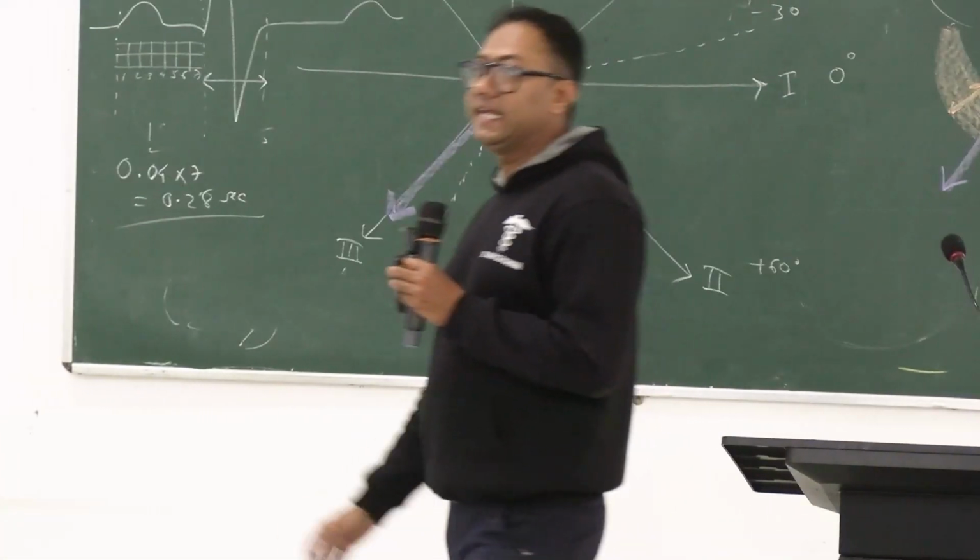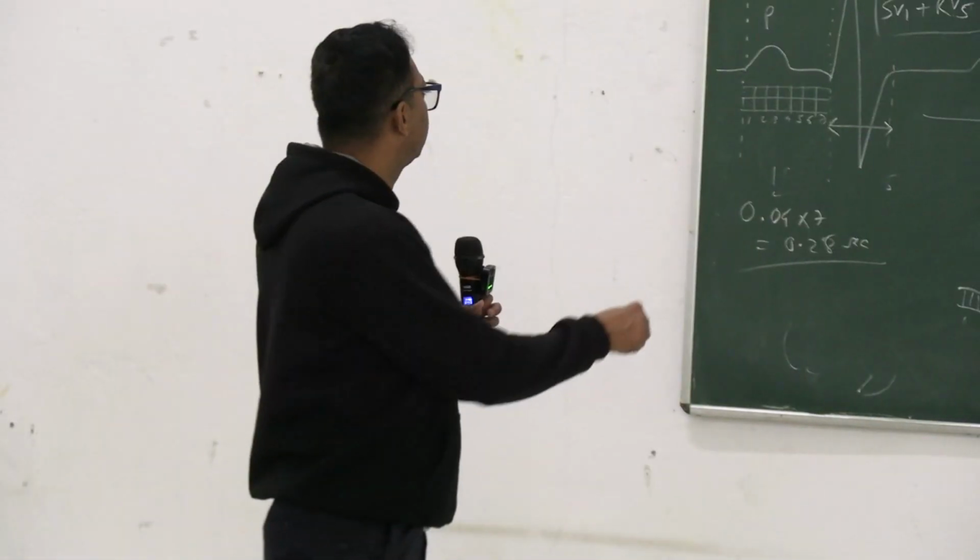And next is the ST segment. Okay, what is the ST segment? This one.